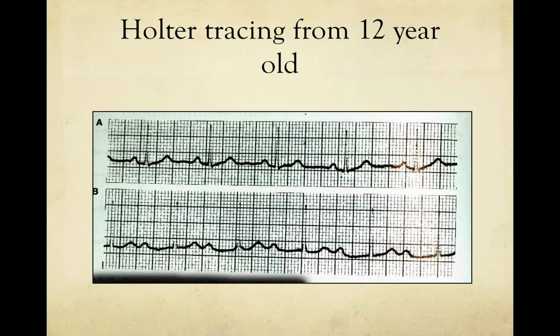Right, which is another way of saying what? It's a first degree heart block. Yeah, I agree with you 100%. I think this is probably an example of somebody who is conducting, as you said correctly in panel A, with a normal PR interval, and then in panel B, for some reason, is conducting with a very long PR interval. Now, you're right to question whether or not those P waves are conducting.